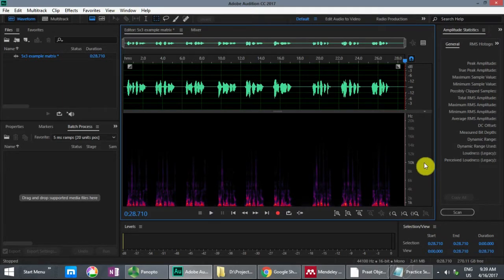Now the spectrogram below the waveform view is going to be very useful because it's going to allow us to see the harmonics of the voiced sections very clearly, and that will really help us to know exactly what part of a particular phoneme we are editing.